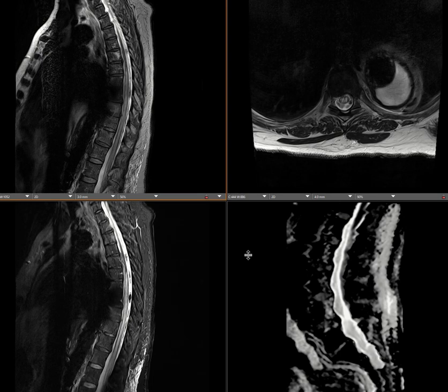Today we are going to discuss one important entity about spinal cord injury, specifically cord infarct, or cord stroke basically. This is a very interesting entity that is actually rare, but I just wanted to show you guys one of the characteristic radiology signs for cord infarct.